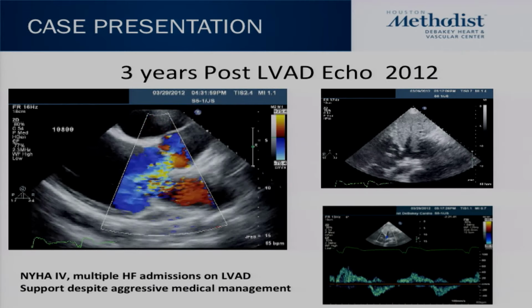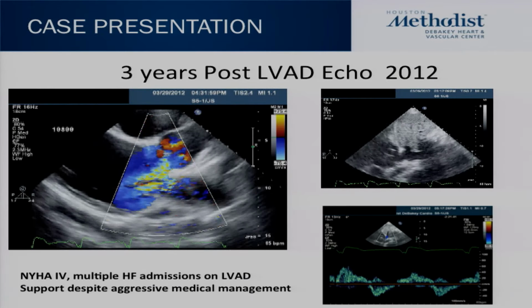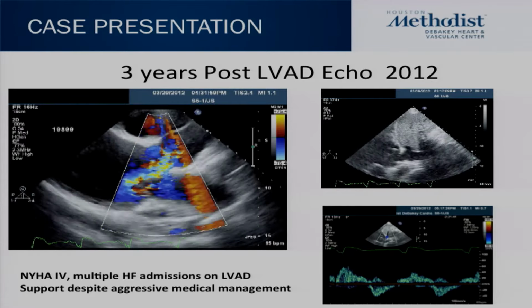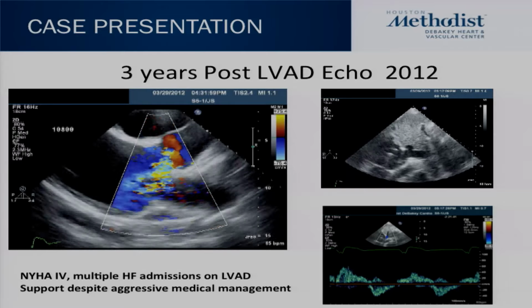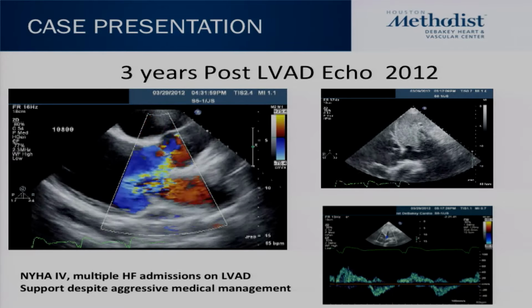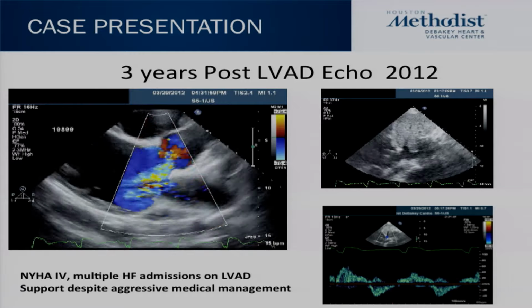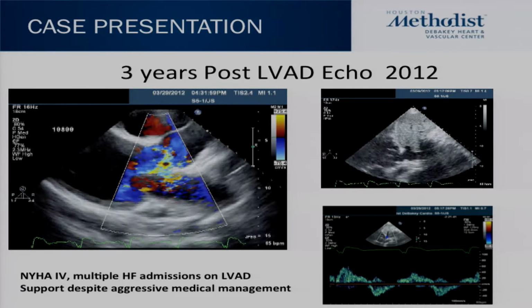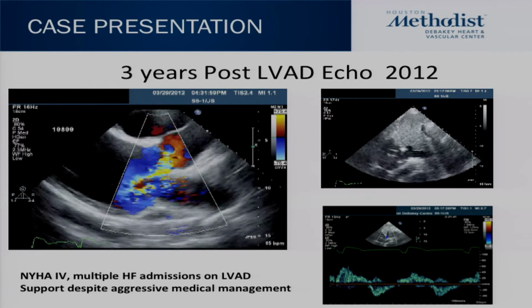And if you look at the 3-year, this is rip-roaring aortic regurgitation. When it comes to this point, most people can tell that this is severe aortic regurgitation. There is little doubt in anybody's mind that this would be significant aortic regurgitation, even if you want to shy away from calling it mild, moderate, or severe, because we don't know accurately how to quantify aortic regurgitation in these patients.